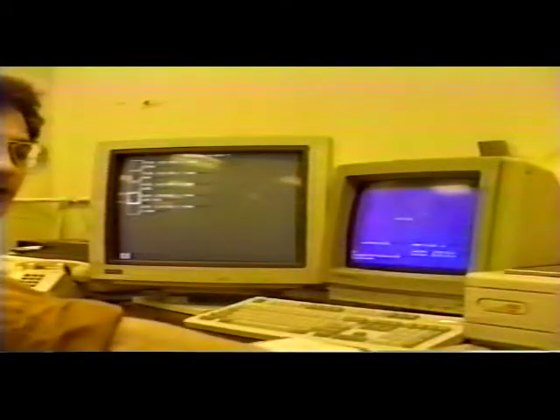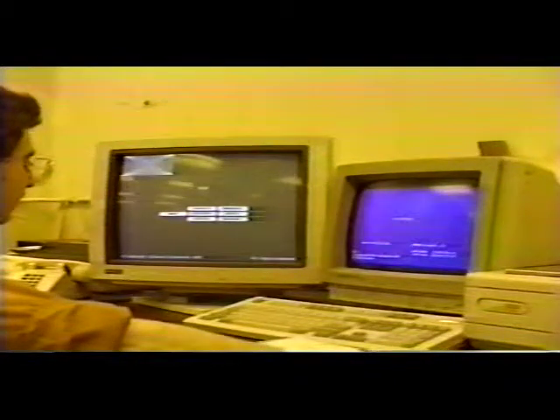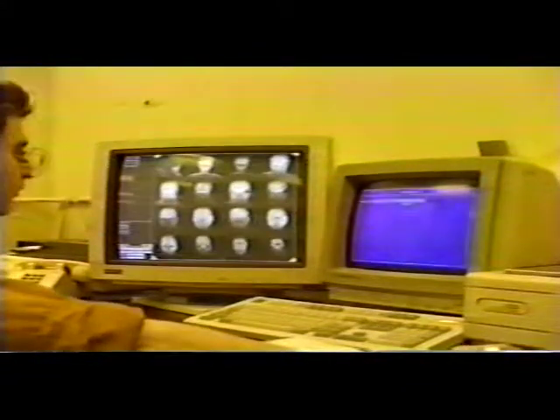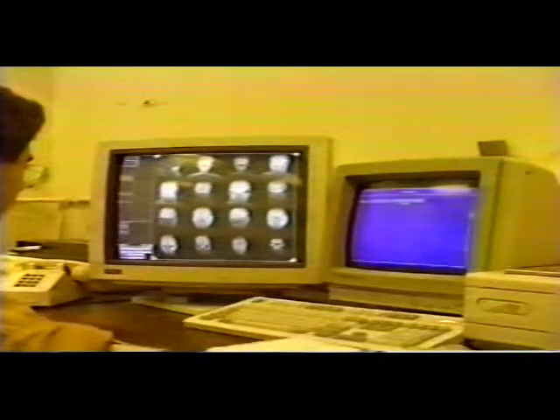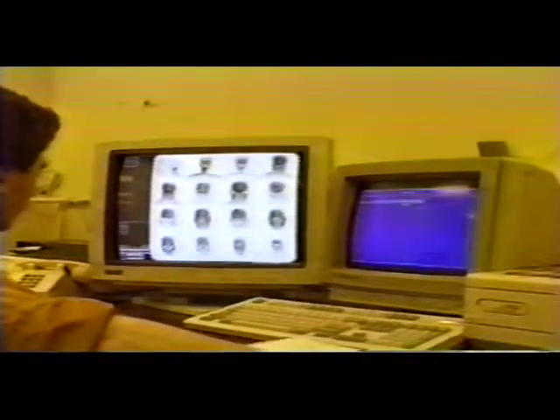Also, if I go to the form, I can edit anything I want. We can also do magnetic resonance scans. If you want to see a black bone study instead of a white bone study, you can convert. It's pretty fast.